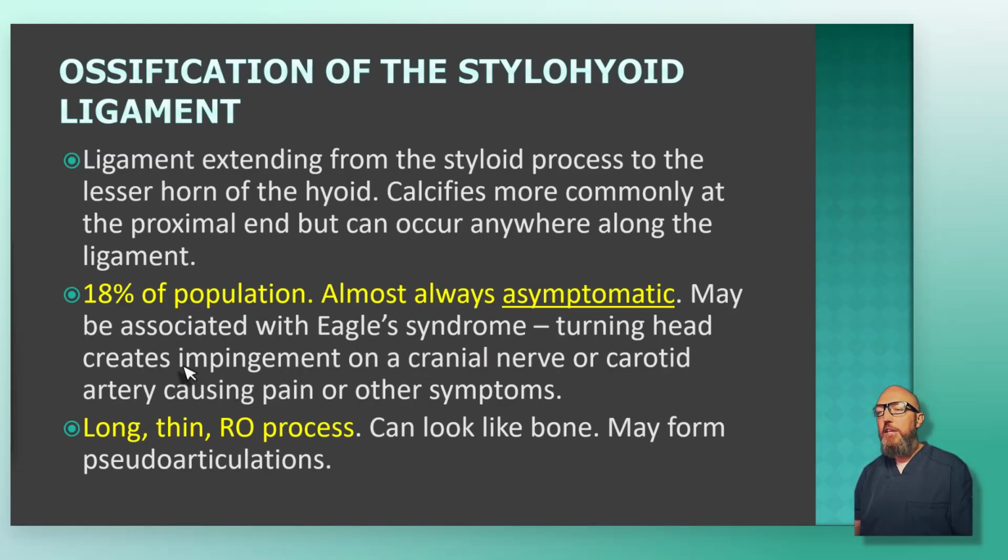So that calcification, if the patient turns their head, it may impinge on the cranial nerve, the vagus nerve typically, or the carotid artery. Typically it's pain somewhere around that area, but if it creates pressure on the vagus nerve, that can cause lightheadedness or other symptoms.